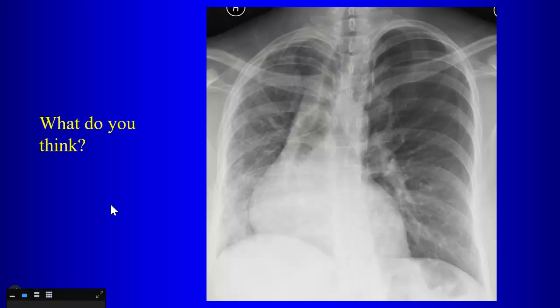So why do you think the mediastinum is shifted? Is there some right-sided atelectasis? Okay, so there's volume loss in the right lung, right? Is there atelectasis? I mean, do you see obscuration of anything? Is the heart border obscured? Is the diaphragm obscured? Not really, right? So it looks like the volume on the right side is decreased. Now, when you look at the vascularity, we notice that the left pulmonary artery looks somewhat enlarged, okay? And maybe a little bit of interstitial prominence on the right there.